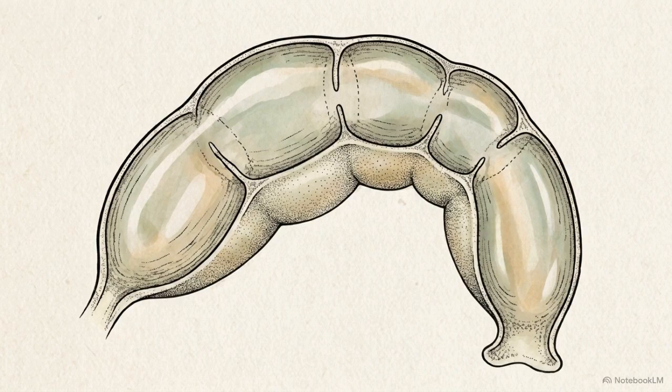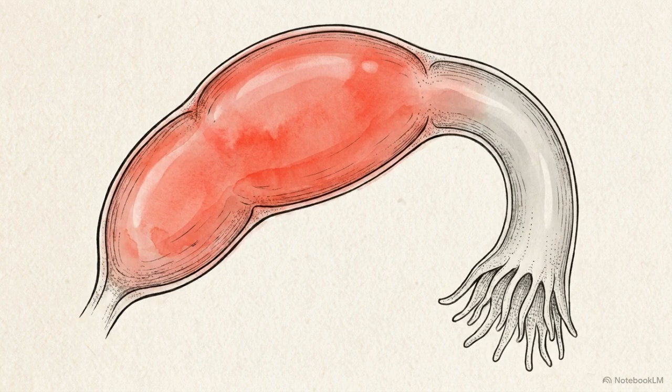This rendering demonstrates how we identify issues in the fallopian tubes. This dilated, fluid-filled, sausage-shaped structure with incomplete internal walls is a classic presentation of a hydrosalpinx, a blocked, damaged tube often tied to chronic pelvic pain.